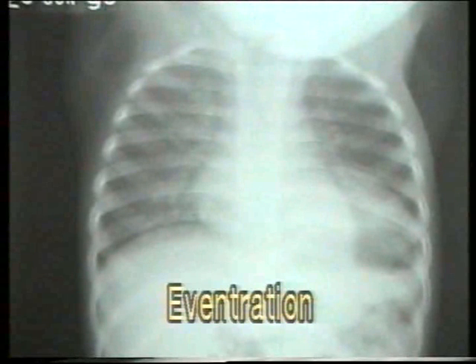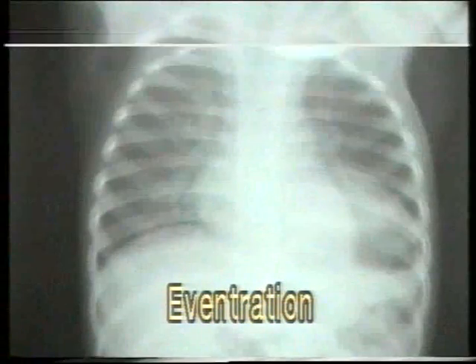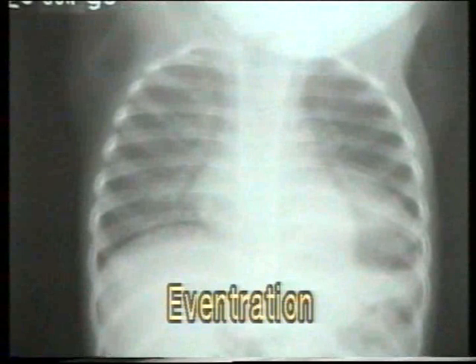This X-ray shows eventration of the left hemidiaphragm. The diaphragm is raised and shows bowel gas underneath it. Now this is a post-operative X-ray of the same patient showing repaired diaphragm in its normal position. Compare it with the pre-operative X-ray of the eventration.